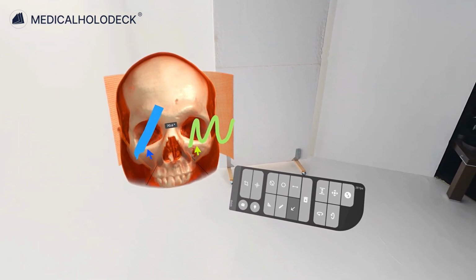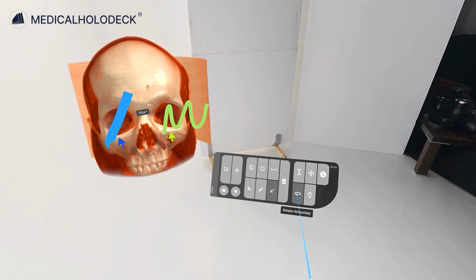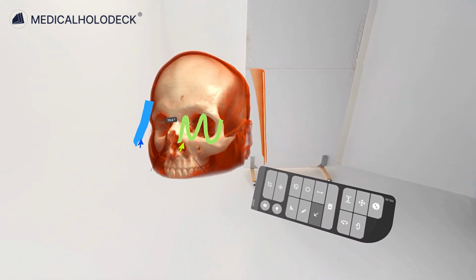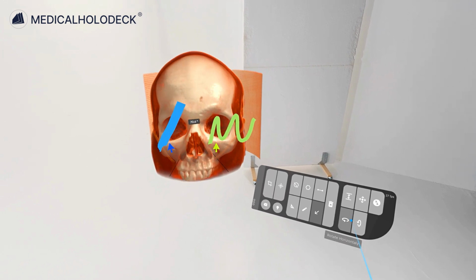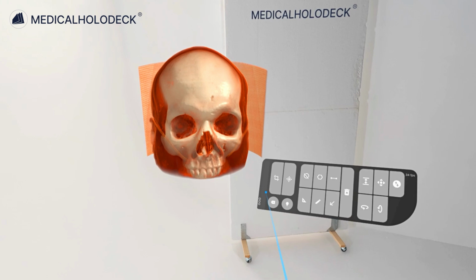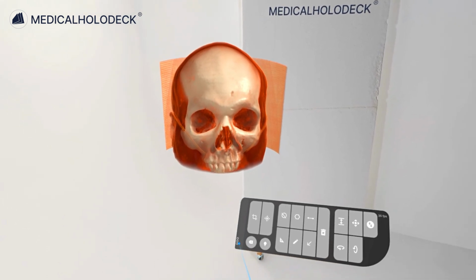To rotate the dataset, aim at the Rotate horizontally or Rotate vertically button. Hold the trigger and move your controller left and right for horizontal rotation, or up and down for vertical. Reposition the object pad by aiming at its handle, holding the trigger and dragging it to a desired location.